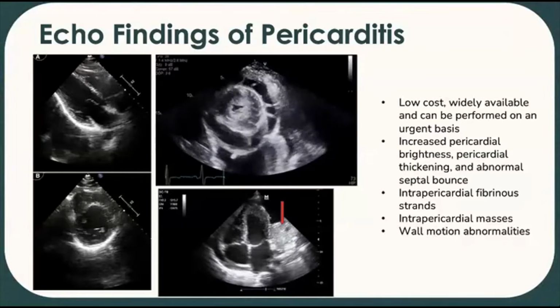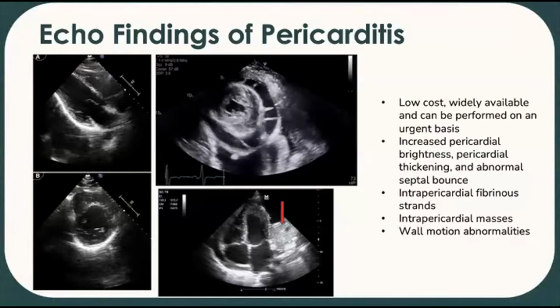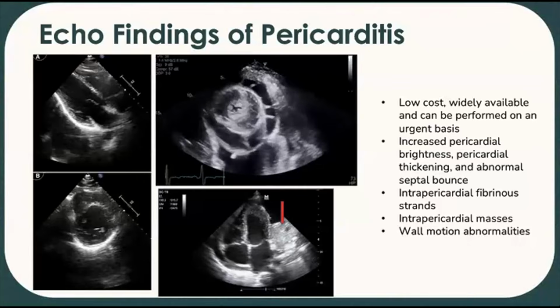Echo can also be really helpful to at least somewhat differentiate acute pericarditis from myocardial ischemia by excluding wall motion abnormalities, even though there are a small percentage of patients with acute pericarditis, about 5%, who will demonstrate segmental wall motion abnormalities. But it's an important indication because, as we know, not infrequently these patients will get referred for coronary angiogram for suspected STEMI because of the ECG changes.